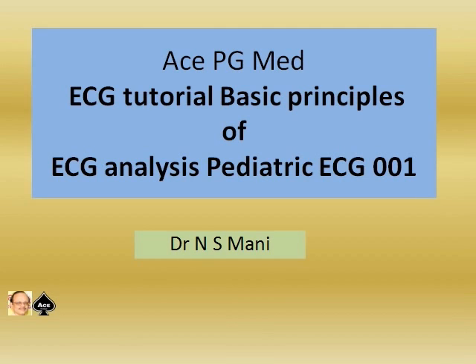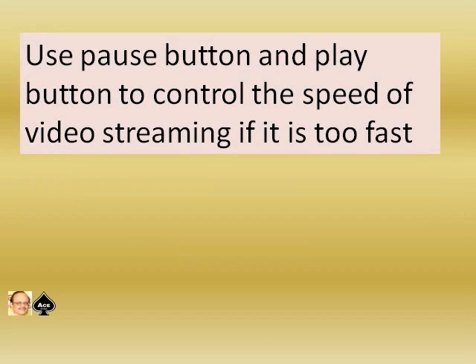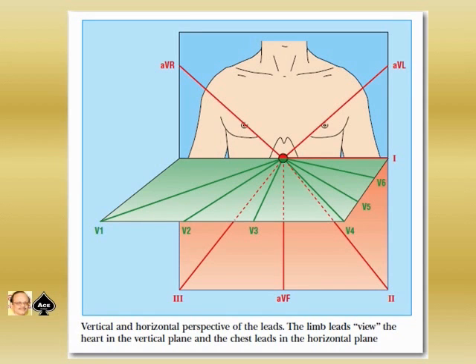In this series of videos, I'm dealing with the ECG analysis of pediatric patients. Use the pause button and play button to control the speed of the video streaming if it is too fast.